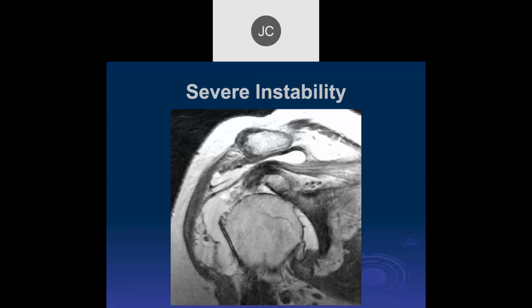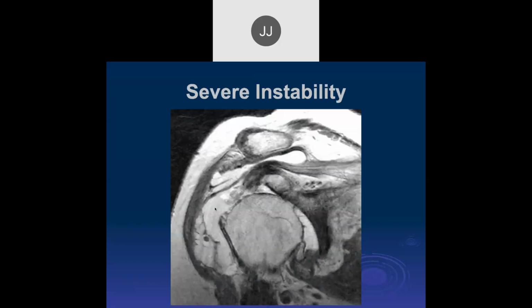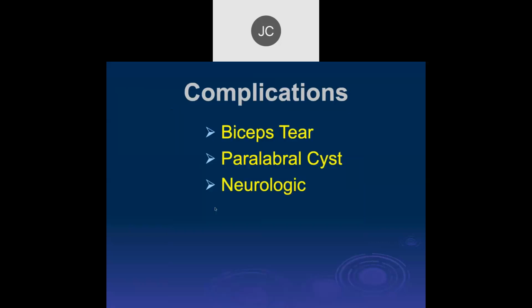What's important here is severe atrophy of the deltoid muscle. There's really not a whole lot they can do here without a good deltoid. I'd go upstairs on this one. Make sure you don't have a neurogenic cause of disease, so I would definitely do an MRI scan of the cervical spine.